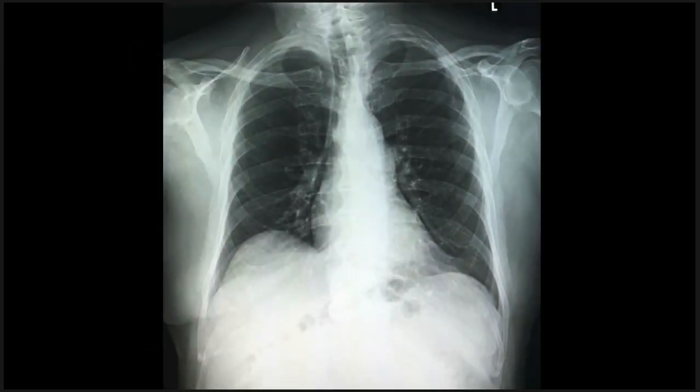Alright. So often, when you're looking at a normal chest x-ray, you can see a thin, well-defined black line around one or both margins of the heart. And like I said, this is actually an optical illusion called a Mach band, or some people call it a Mach effect. Now, you'll see this so frequently that you'll get pretty used to ignoring it. And the main thing that's helpful is that clinically it just makes no sense for this patient to have a pneumomediastinum.